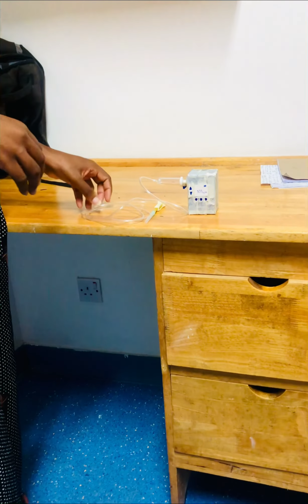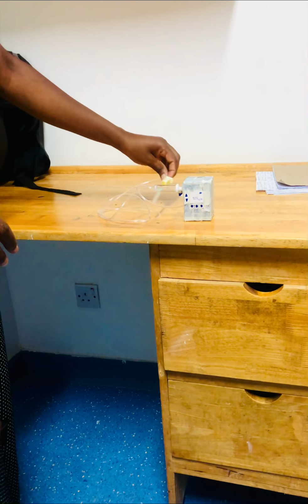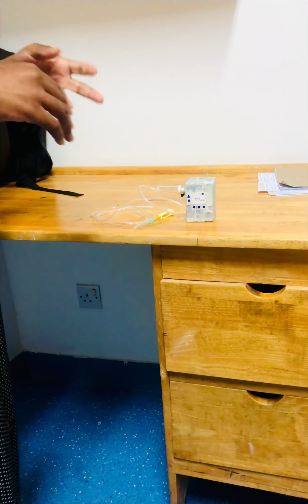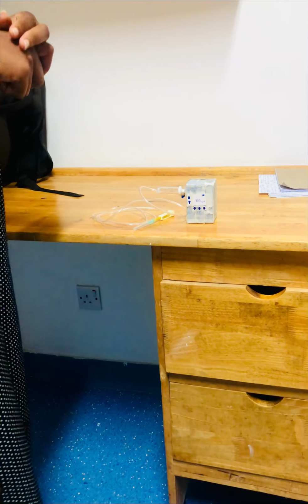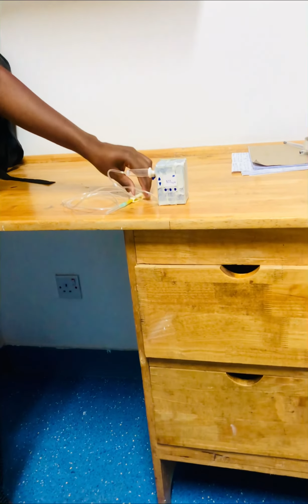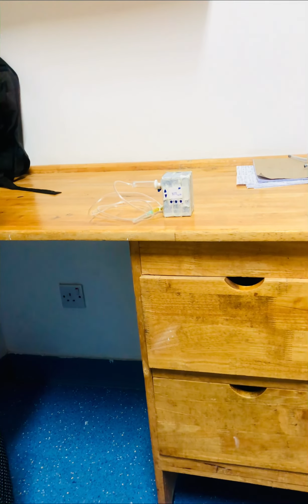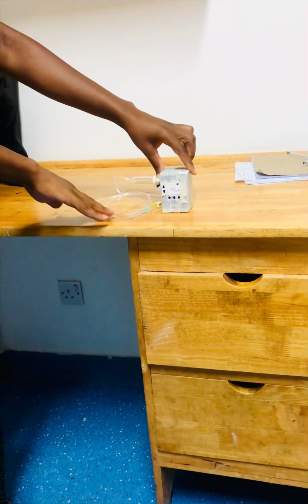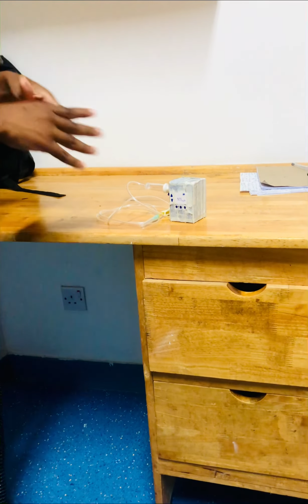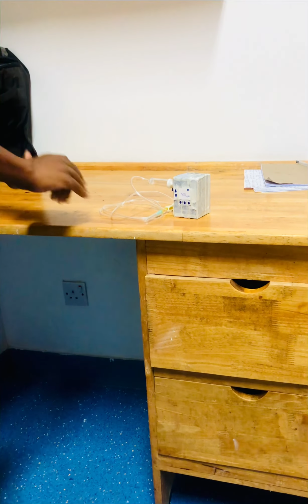And it can even be used in hospitals by nurses who have very tight schedules. It can be used by people who are very busy, everywhere they are going, at work, at home. It can also be used by guardians at home who have diabetic patients. So we are sure that this kind of prototype, this kind of system, is going to be of benefit to many users in the health sector of Malawi. Thank you very much.